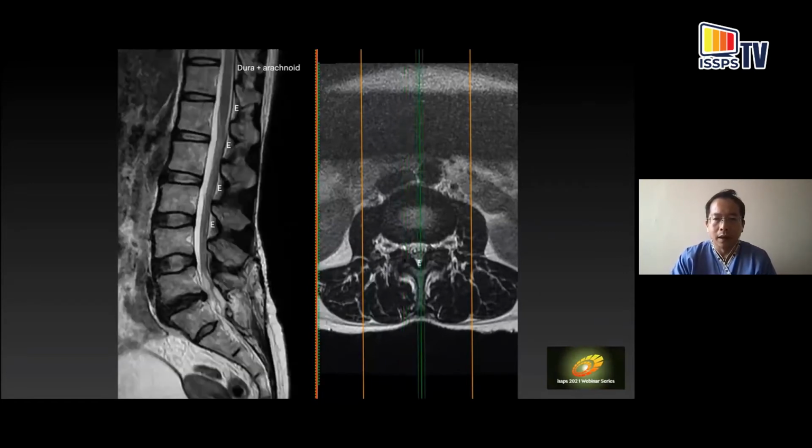And here you see it has jumped from just about lateral to the interlaminar space directly onto the spinous process and in the midline, where you can see the spinous processes here, the supraspinous ligament, interspinous ligament, and then the epidural space right here in the midline. Okay, so this is real world stuff. You don't always get picture perfect images, but it's worthwhile to go through them to identify how much space you have to maneuver.